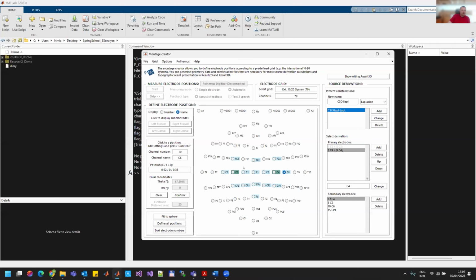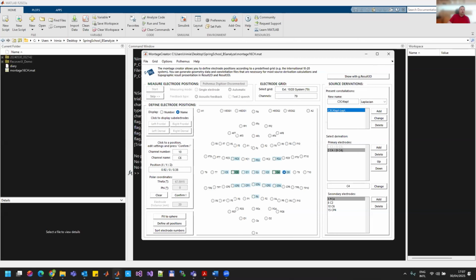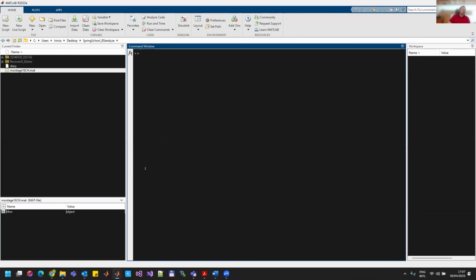Basically now I created this montage and I will save it because we will use it a bit later. Save montage as plus 16 channels. Now that I saved it, I can close the montage creator. We already see it in here, and I can clear the screen.